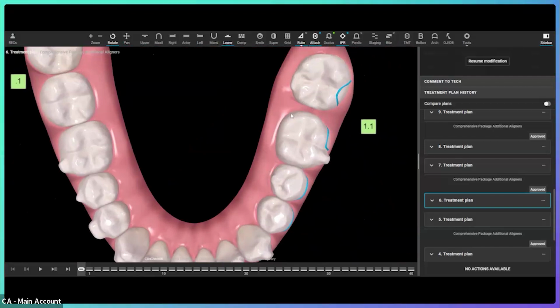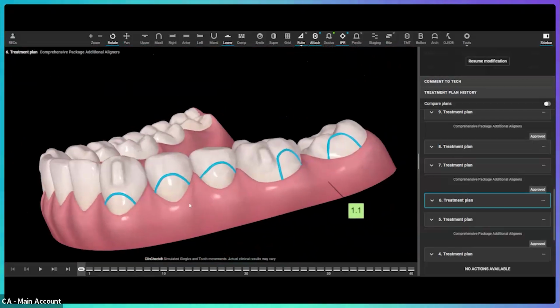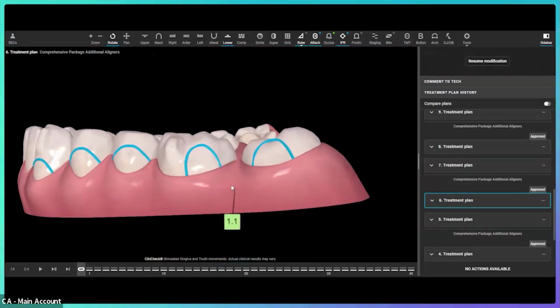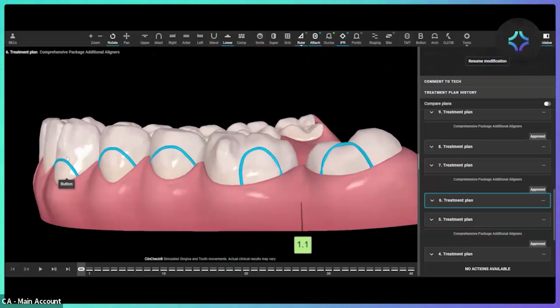Where we'll often go ahead and cut so we don't have it covered with aligners is we might cut off the back tooth. We'll cut off the 8. Because if we cut off the 8, then that can move as quickly as the brackets will allow it to move. So in this case, that is what we do too: we cut around here as needed, and then we cut off the 8. The 6, 5, 4, and 3, we're not cutting off because we want these teeth to all stay locked into the aligner so that we don't get any unwanted side effect movements, but you'll see that still happens anyways.